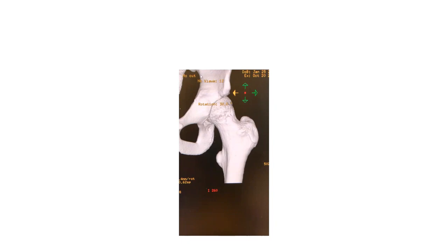So going back to how you describe a fracture, okay? Up on this board, we have multiple examples of displaced fractures, okay? But you can also, when you call somebody and try to describe a fracture to them over the phone, you want to try to use the verbiage that is going to best communicate what's going on. Does anyone want to take a stab at this one?